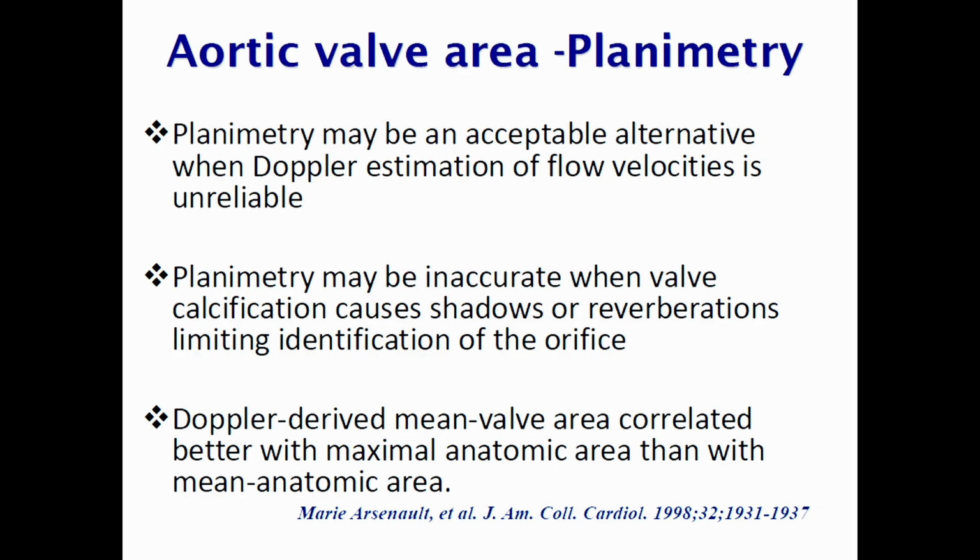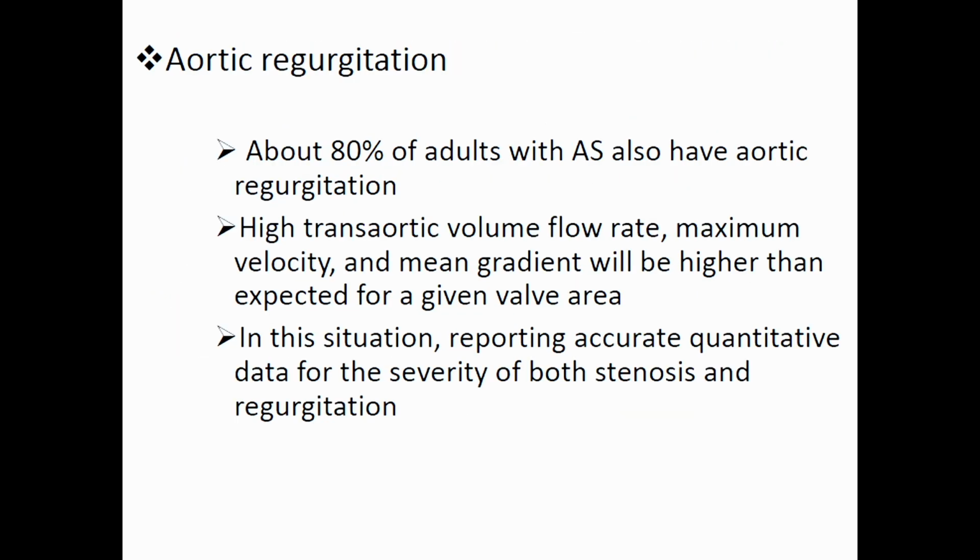So the TKR patient, if they are doing it, they can find out if there is aortic valve disease as well. But anyway, the patient is going to come for cardiac surgery, the patient who has AS. But to rule out whether this is true AS or a low flow, low gradient situation, we can do that. And the final thing is aortic valve planimetry. But as usual, planimetry can be inaccurate because of the calcification and all those problems.